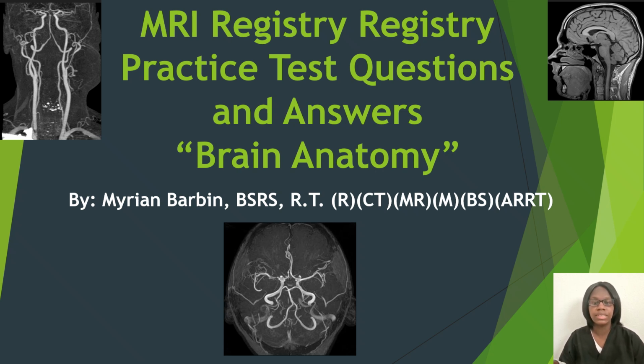In today's video, this is the MRI Registry Review. I have practice test questions and answers for the brain anatomy.